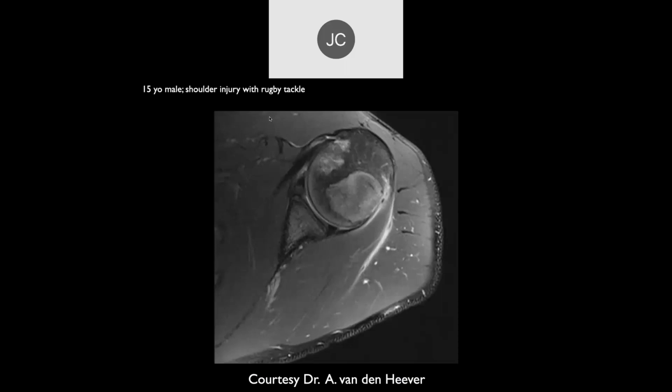Okay, Tayson? Right. 15-year-old male, shoulder injury, rugby tackle.